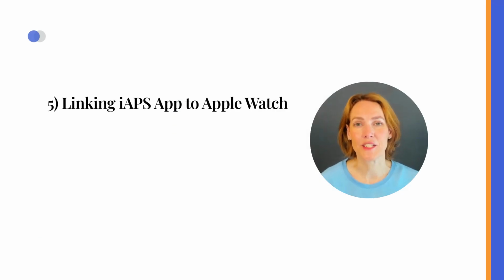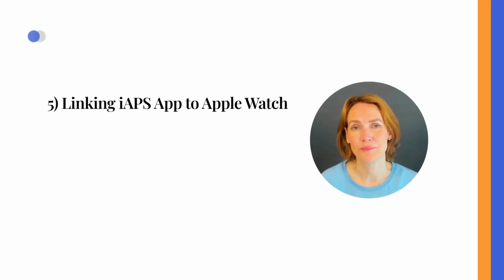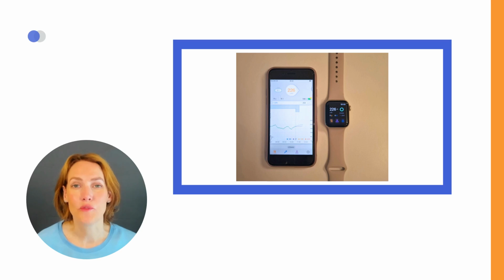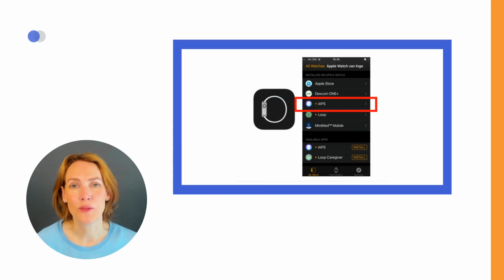5. Linking your iAPS app to an Apple Watch. Using an Apple Watch will not only allow you to follow your sensor glucose and insulin on board on your wrist, but also allow you to add carbs, bolus, and select set, stop a profile from your watch. iAPS will automatically be downloaded on your connected Apple Watch.